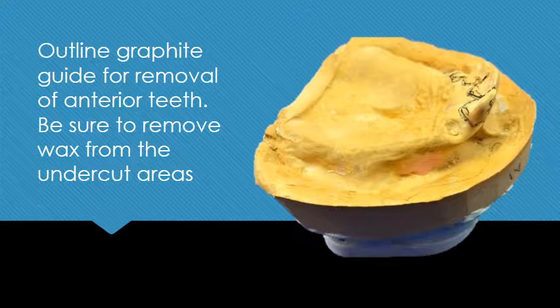The cast shows a high wall of stone on the anterior land portion, which will block out our view of the remaining undercut area. So at the same time as removing these teeth, we're going to lower that wall so that we will have an accurate reproduction of the undercut area, which will be part of the modification.